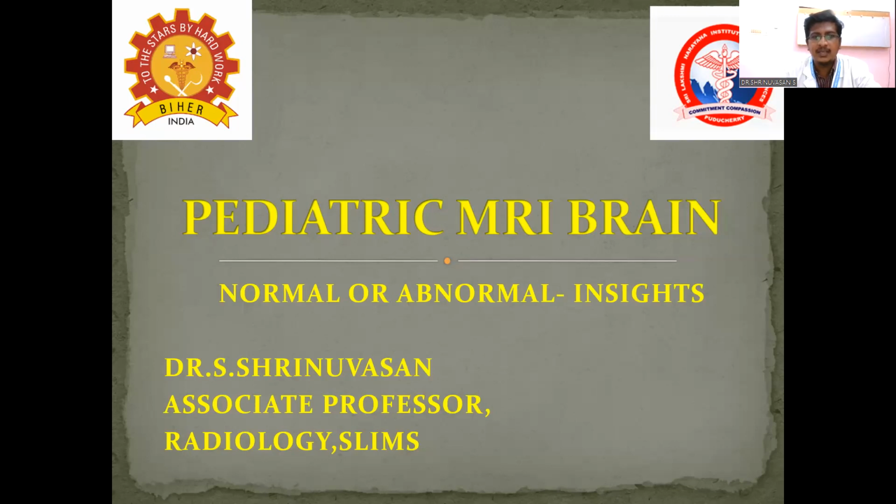In this session, I am going to talk about pediatric MRI brain. So what is the specialty of MRI in the pediatric brain? Usually in the pediatric age group, the development takes place in the first 2 years. The myelination process, maturity, all the development processes take place in the first 2 years. No other modality can show you the processes that are happening in the brain. Only MRI is the modality which shows the maturation process and the changes that take place in the development of the brain.